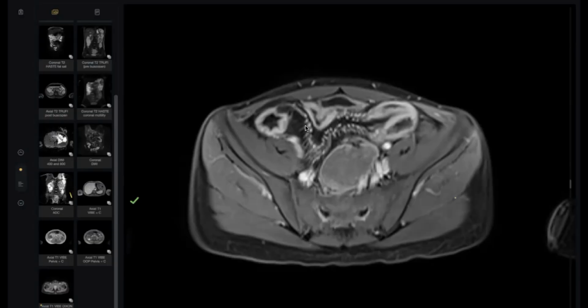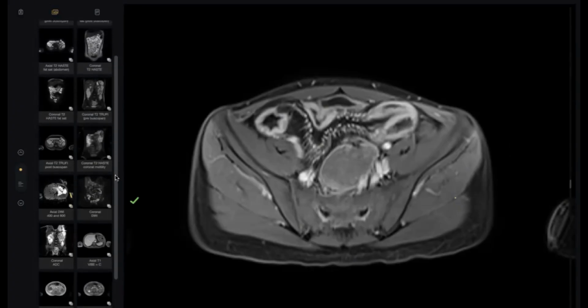No, this is outside. These are vasa recta, congestion of engorged vessels. What is the name of this sign? Comb sign, engorged vasa recta. Excellent. Comb sign.